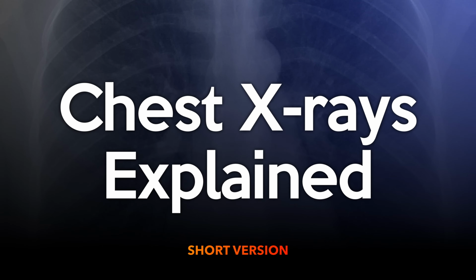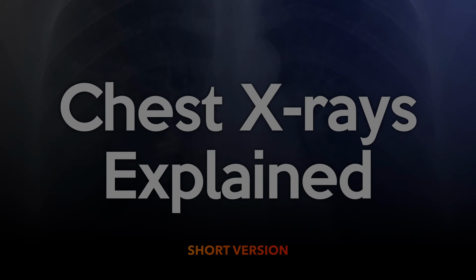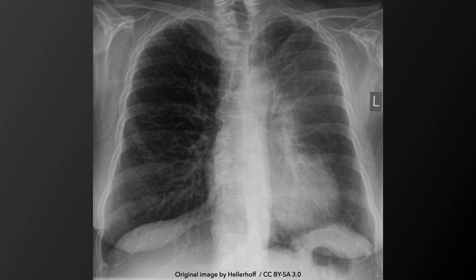This lecture will describe the chest X-ray findings of 20 different conditions, starting with atelectasis. This is a chest X-ray of left upper lobe atelectasis. Take a brief moment to observe the radiograph. Is there anything that you can comment on?